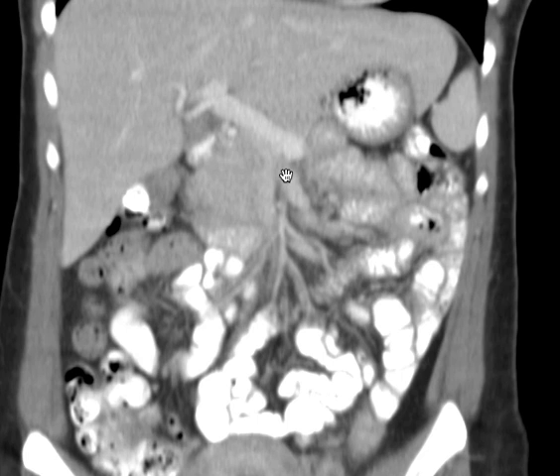These are not as dense as this because of the timing of the contrast bolus, and more has gotten back into this vein, the portal vein, as opposed to the superior and inferior mesenteric veins, which don't have as much contrast because there was a longer route that had to be taken by the contrast to get to the bowel and then come back here.